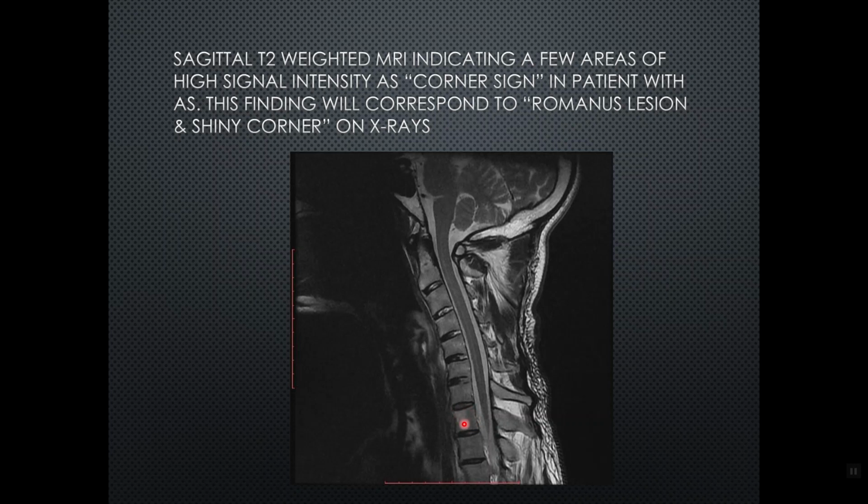In this case, you can also see there's some bridging of bone, so that's formation of that marginal syndesmophyte. As you can see, it produces signal intensity very similar to bone, and that's what it is. It's literally just ossification of that annulus fibrosus due to ankylosing spondylitis and enthesitis. Similar changes are found right there at the C2 and C3 area, and even here somewhere at the fourth cervical vertebra, sort of C3, C4.